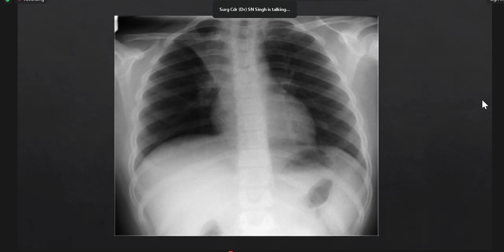What I'm telling you is, since our brain is presently concentrated on collapse, we are not thinking on those things. But in examination, it can be anything. So everything has to be a broad horizon. Okay, fine. What do you think this is? This sharp margin.